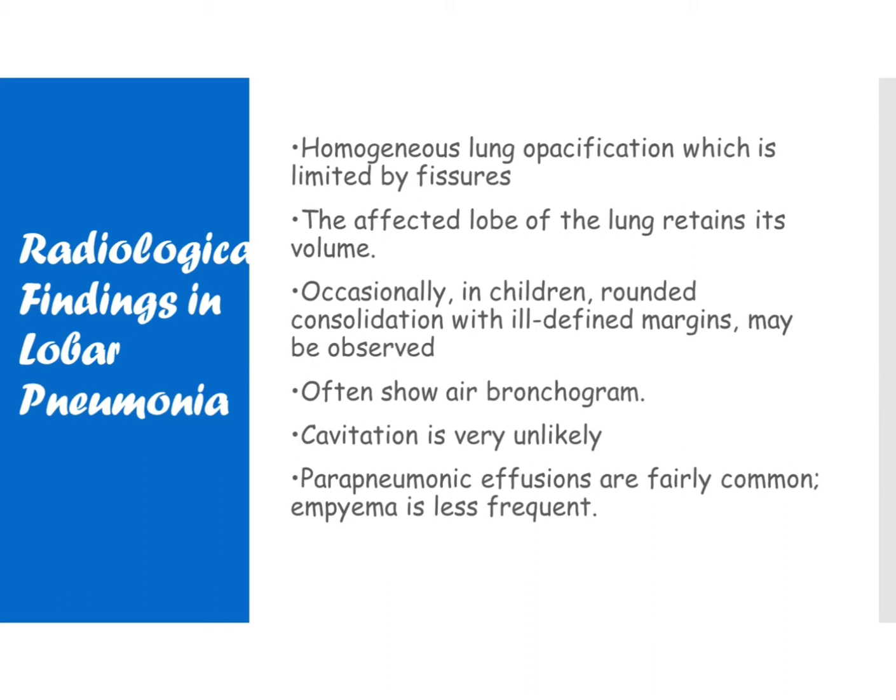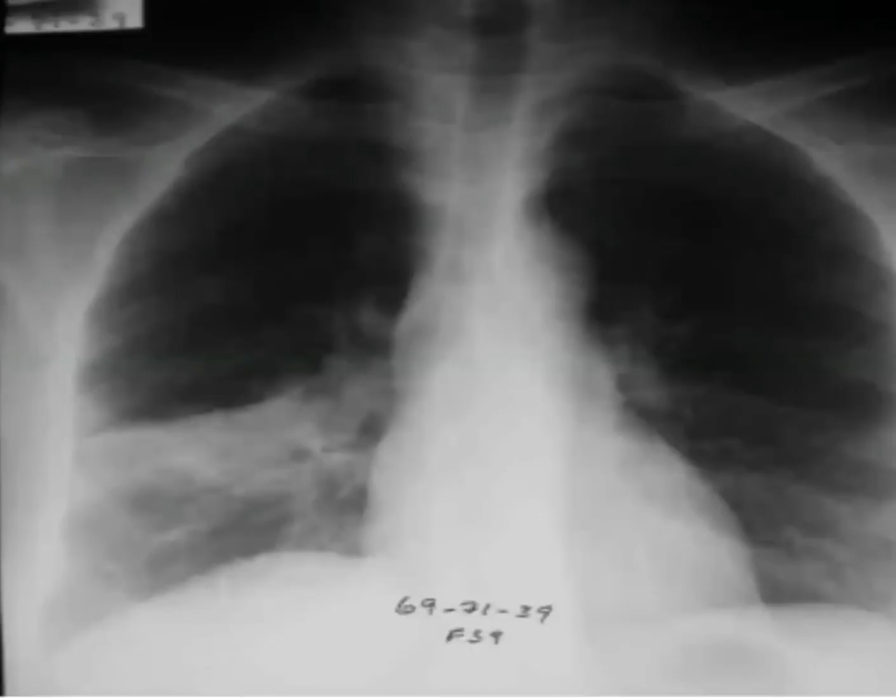Then it often shows air bronchograms. Cavitation is very unlikely, however, it may be present. Pneumonic effusions are fairly common and empyema not so frequently. So let's look at the X-ray.